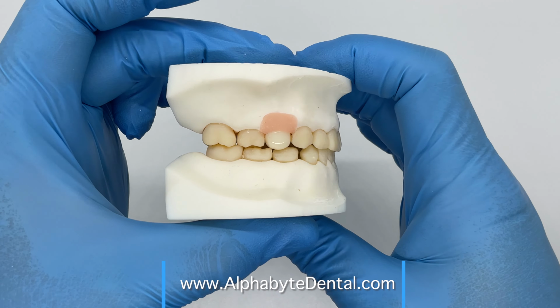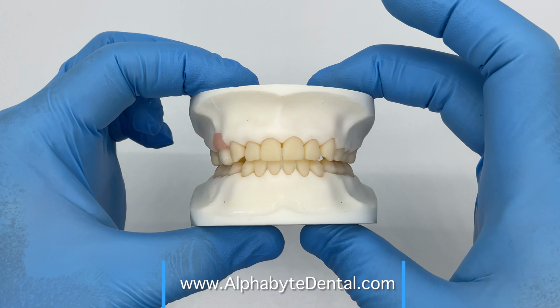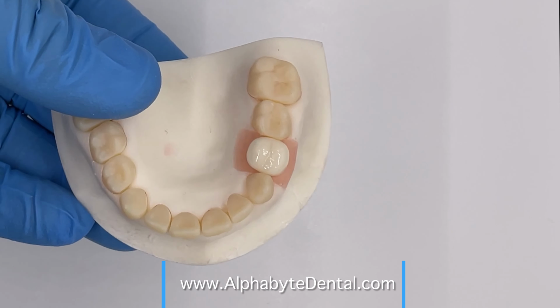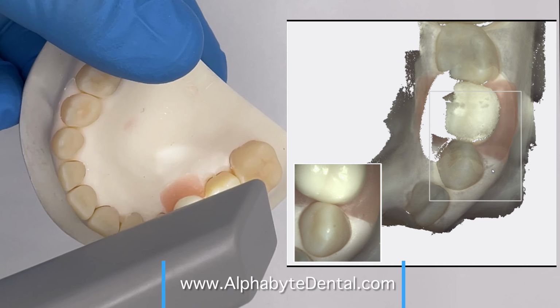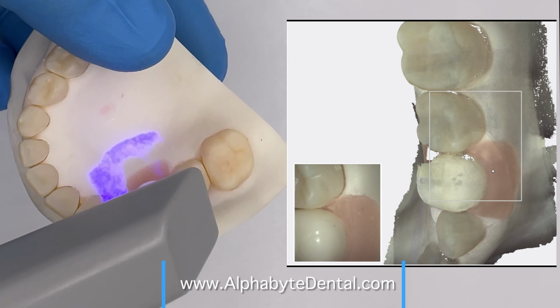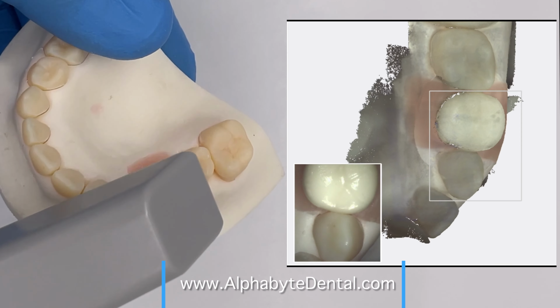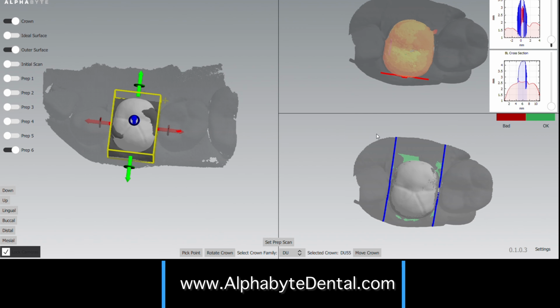So in this case, we can now accomplish even single teeth as efficiently in zirconia as we could with stainless steel. And maybe it's an academic exercise, but for those of us that want to be more trusting of the computer guidance here, we can go back in and scan the post-cementation crown position and reanalyze how well we stayed true to the digital proposals.